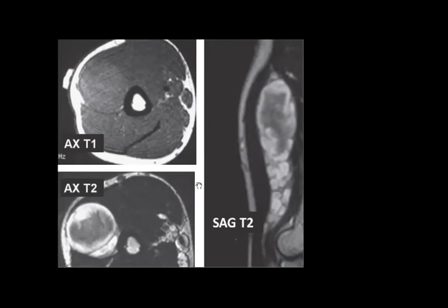The differential will be the schwannoma. How you can differentiate? Sometimes it's very difficult to differentiate. Yes, perfect. You cannot differentiate easily.